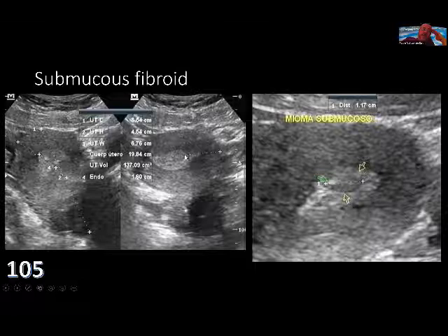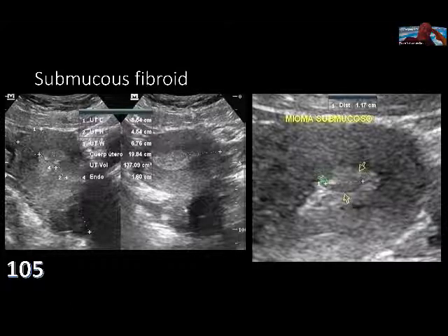This small thing looks like this, gray shade color. This looks more like myometrium than anything else. So this should probably be labeled a submucous fibroid. Endometrial things are usually the cause of abnormal gynecological bleeding with some cramping sometimes.